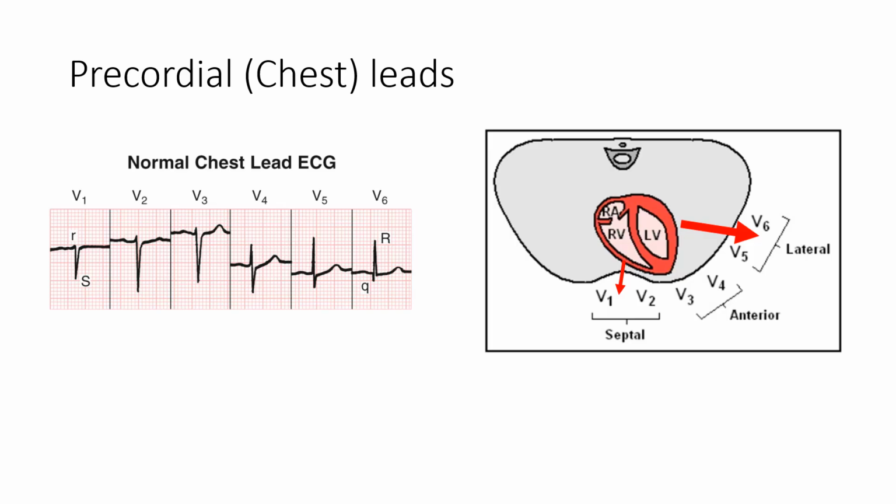We can call that a septal R wave, and then a subsequent S wave. Now, the subsequent S wave in V1 is, of course, the overall net left ventricular cardiac electrical activity, and because the overall vector is moving away from V1, it becomes published as a negative S wave. As we move across the precordium, we can see that the leads are moving toward the heart's electrical axis in that horizontal plane, and so the leads are becoming progressively more upright until we get to lead V6.